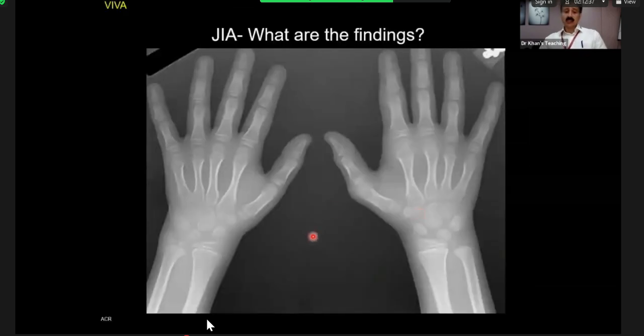Now, is candidate 2 with us? If yes, raise your hand, please. Okay, candidate 2, can you hear me, please? Yeah. Okay, so this is a case of JIA. Can you please tell us your finding?